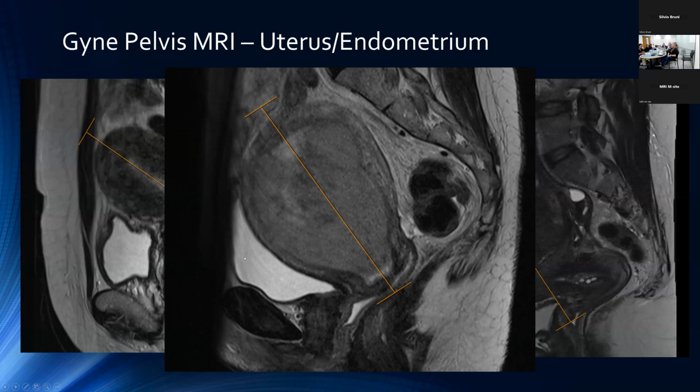And again, the line is drawn along the long axis of the uterine bulk, which in this case remains in line with the slightly expanded cervix below. This mass is bulging into the upper cervix as well, into the upper endocervical canal, but you can see it's all in the same line, so you can just draw that line along the uterus, approximating the bulk of the uterus itself.